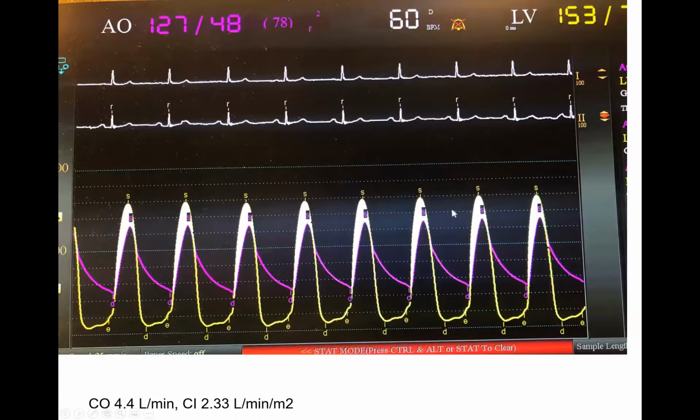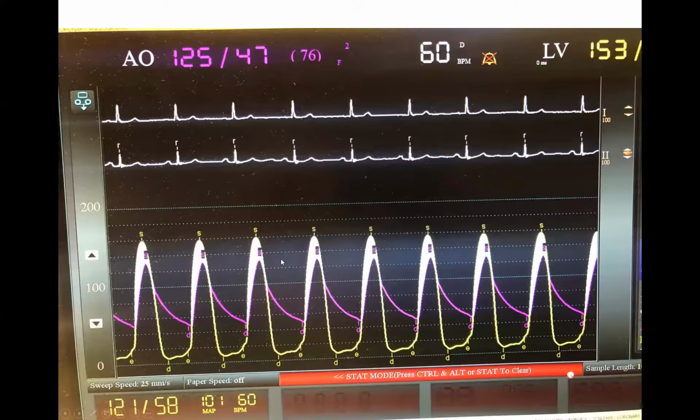You can see the peak to peak is about 40. Yes, peak to peak, every box is 20. So peak to peak, I would say close to 30. You have 1.5 boxes, okay? This is one box, which is 20. This other box is about 10, okay? We measured it as 28, okay? So there is a peak to peak gradient of 28.